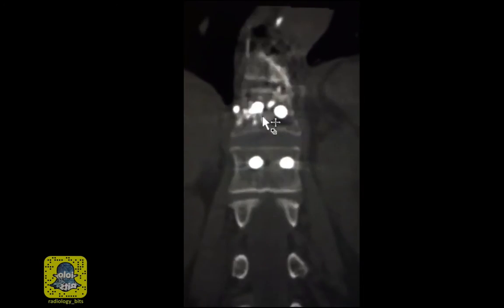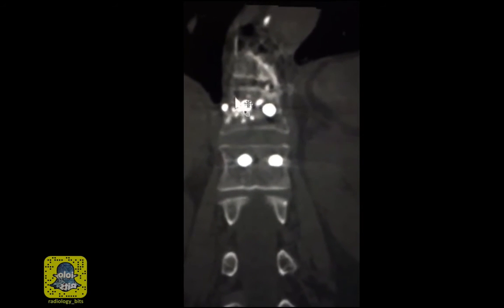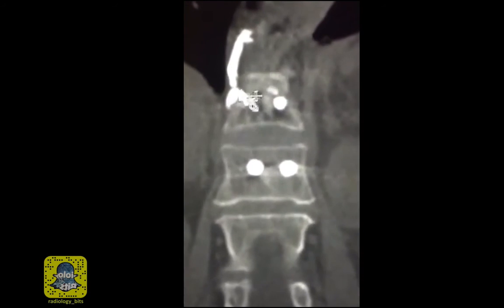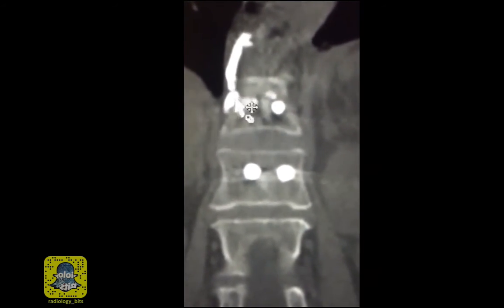With vertebroplasty, there is transcutaneous injection of cement-like material into the vertebral body, classically in the context of loss of height of the vertebral body with osteoporosis to stabilize the vertebral body and decrease pain. Like any procedure, there are a few complications. One of the complications that may be encountered is that the cement squeezes outside of the confinement of the bone and sometimes drains into the perivertebral venous drainage, such as what you see here.